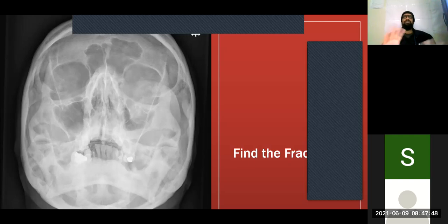No, I know you're trying to find something, but I'm telling you, there is not much. It kind of looks the same. And when we come across here to this line number 3, again, we don't really see much. But here you have this patient in huge amounts of pain. There are odd swellings, massive swellings of the cheek. Are there other things that you can look at? Was there something else that we looked at recently?